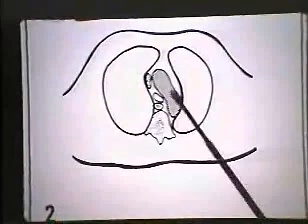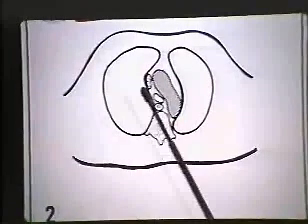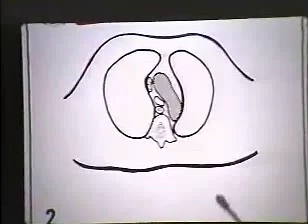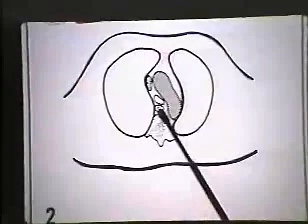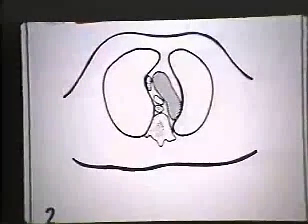Well, first of all, we'll see this large shadow representing the aorta. Incidentally shown are fairly standard bits of anatomy. We see the superior vena cava displaced slightly to the right side by the prominence of the ascending aorta, and of course we will see the trachea, also slightly displaced by the aorta, and we will see the esophagus. Those are the main structures that we'll see at this level, and that makes it rather an easy region to identify and begin the analysis from.